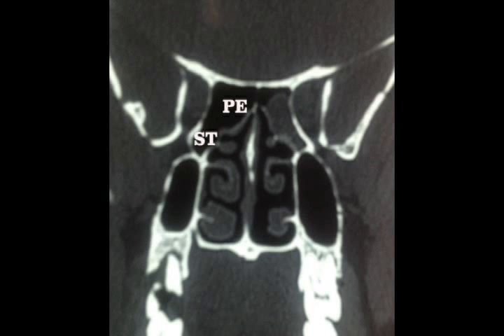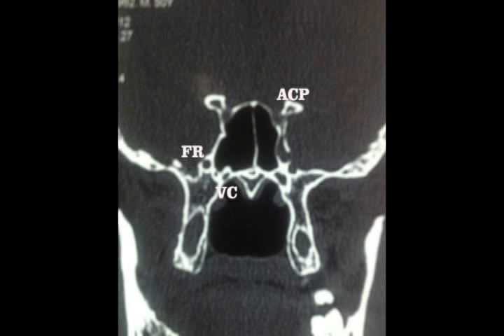So here you are tempted to read the left posterior ethmoid as sinusitis. Never do that. You can see the superior turbinate, posterior ethmoids on both sides. The superior turbinate is seen and the orbital apex is seen. Never read sinusitis right now because you will deviate from anatomy. Finish off the anatomy. You can see the posterior skull base, and then you go to the next cut. Never see the pathology before the anatomy.